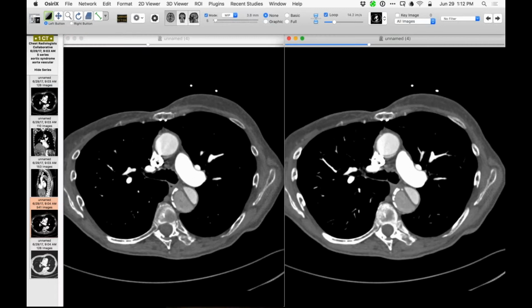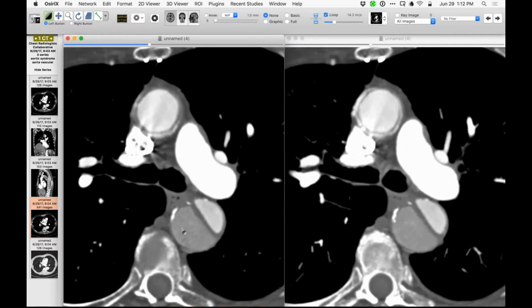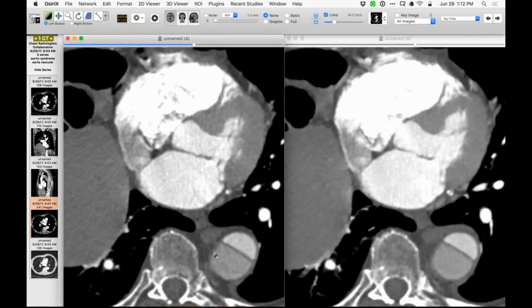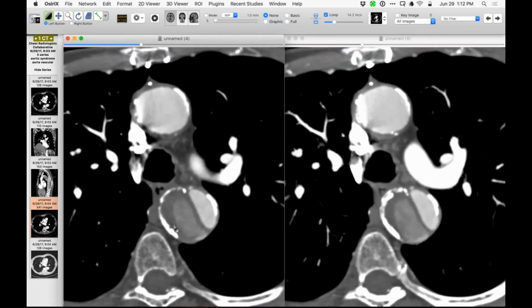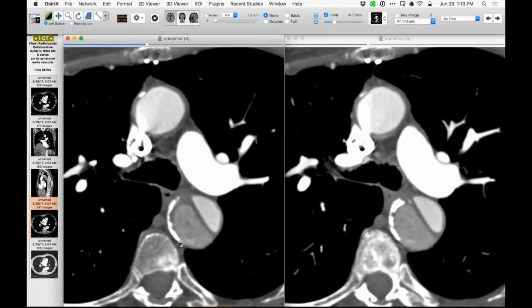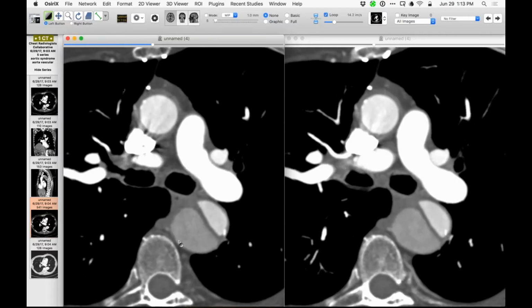So let me show you my observation, which is really subtle, and then tell me if you're convinced. Here at this time, we do have some contrast opacified blood in the false lumen, but not too much compared to the true lumen. So let me scroll down here, because I think I'm seeing a number of places in which very small fenestrations are present between the true lumen and the false lumen, and they appear as little contrast collections and little jets. So let me scroll through there and show you what I'm looking at and see what you think.